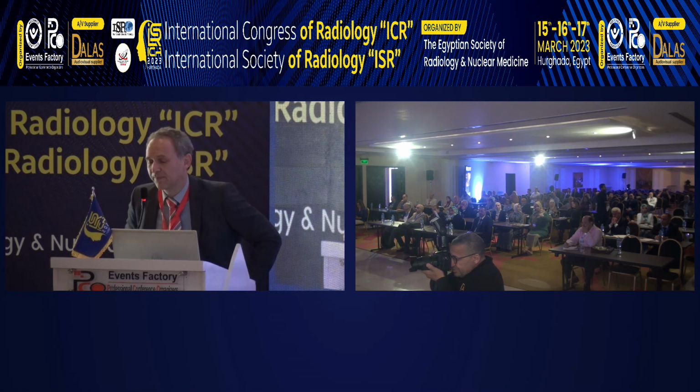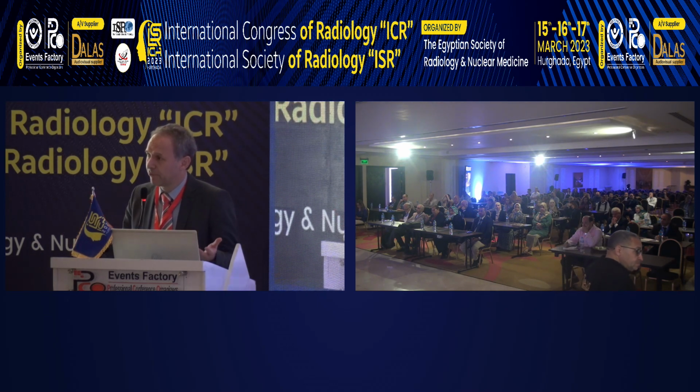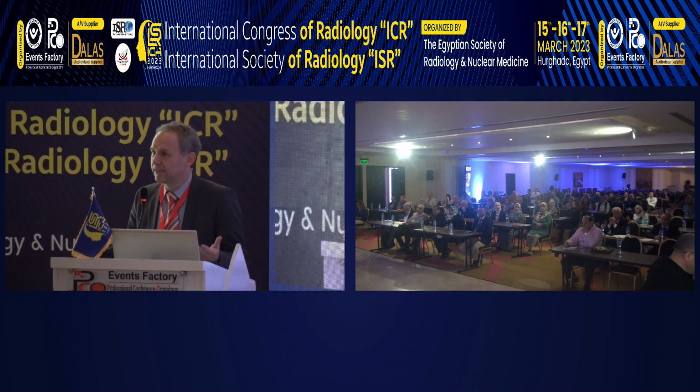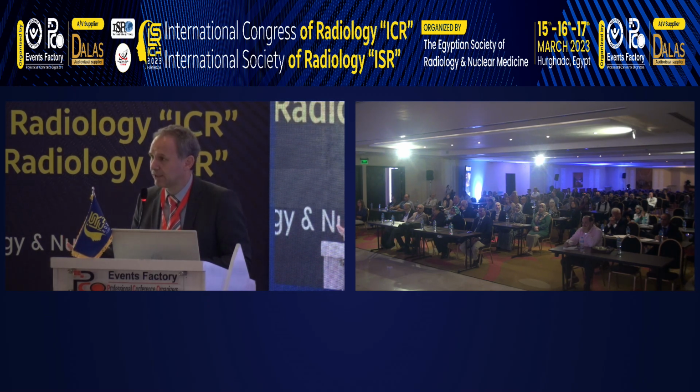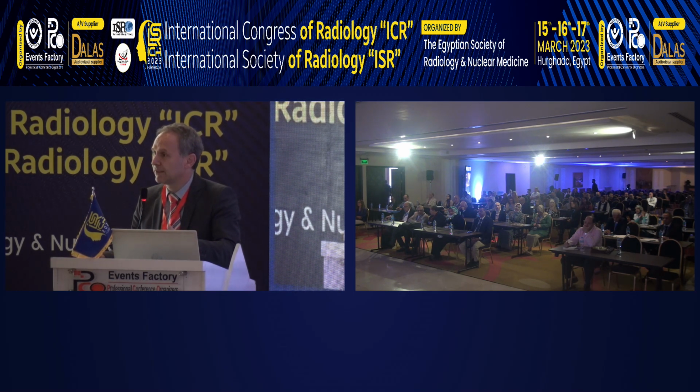If the referral is synovitis, that can be general. You would see that mirrored in the images. If rheumatoid disease would be suspected, you would see a generalized arthritis. You would watch out for osteitis, erosions, tenosynovitis, look at the sinus tarsi to really have additional information. Basically, this is similar to that scenario. You go from your first clue, in this case generalized synovitis, and look whether you find something around. It may be a primary arthritis, it may be degeneration.